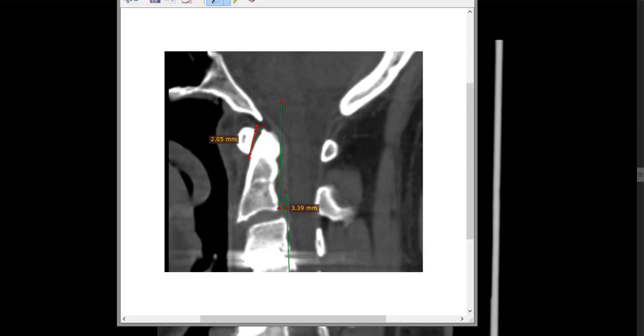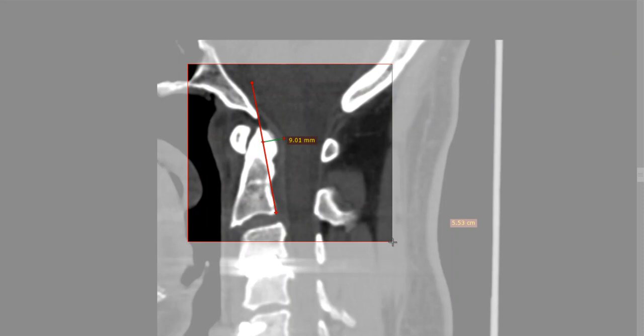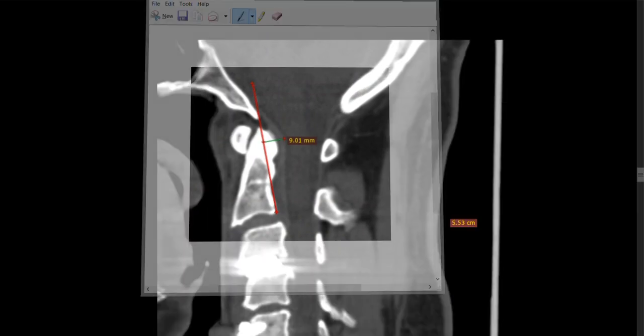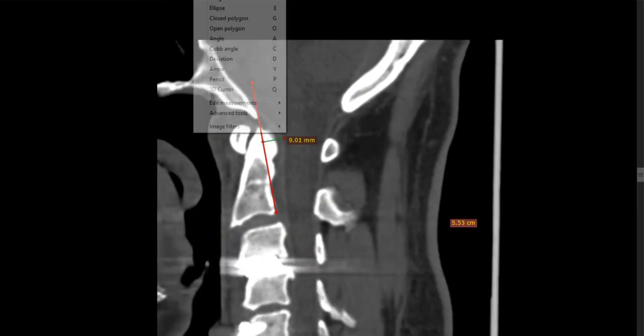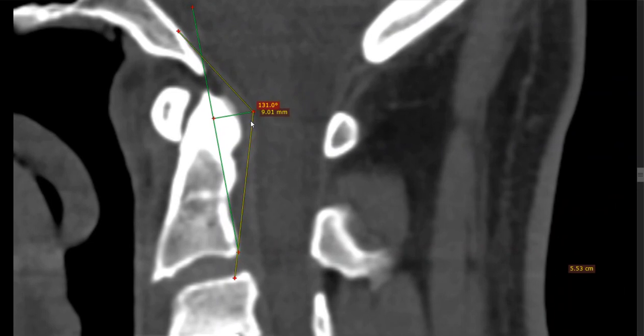So right here, we're going to snapshot this. Actually, you know what? I'm going to do all of them in one shot. So let's just take a look at your angle. Bring this down right to that dot, since that is the central portion, and I can actually make edits. This is already not looking like a good number.